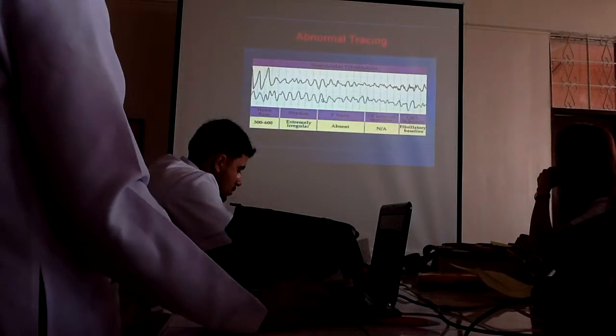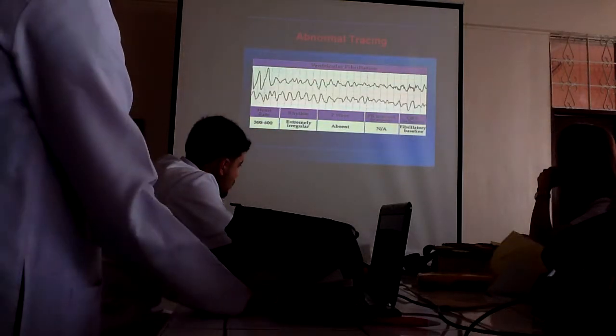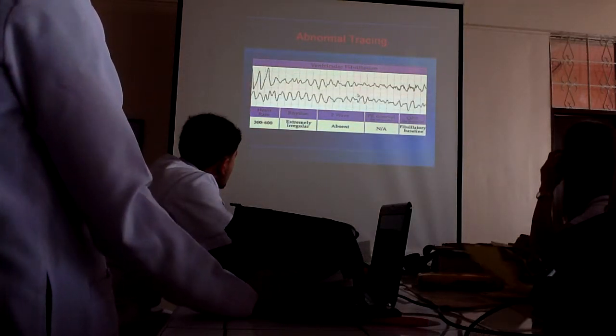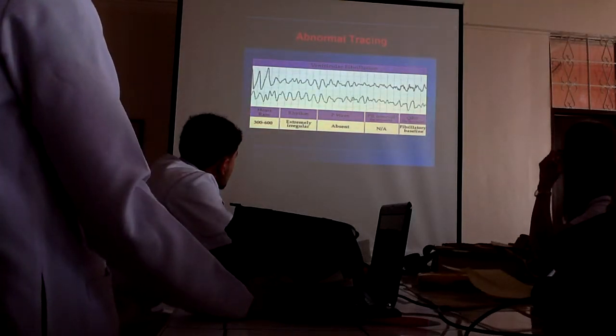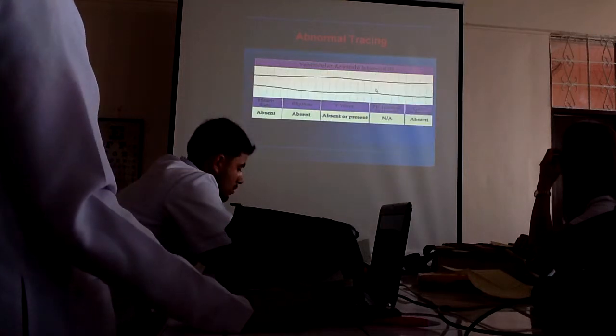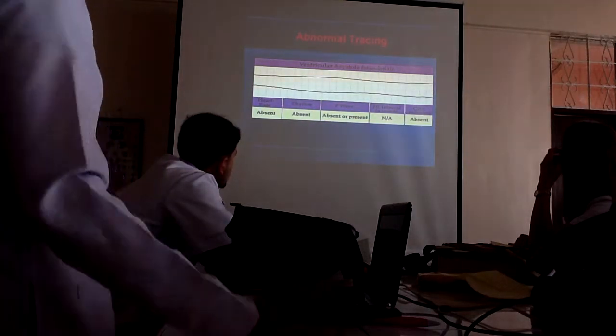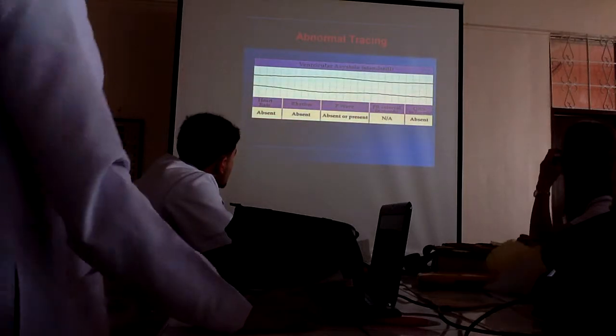Okay. This one is VFib, ventricular fibrillation. So this one is irregular. After ventricular fibrillation, if the patient does not recover, it results in ventricular asystole. When that happens, then you take care of the patient thereafter.